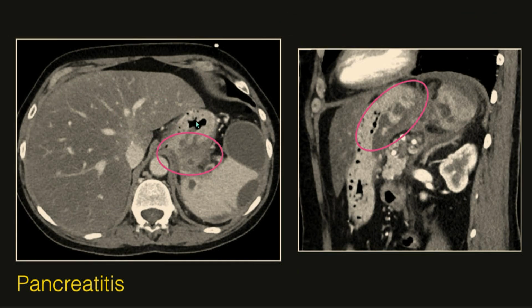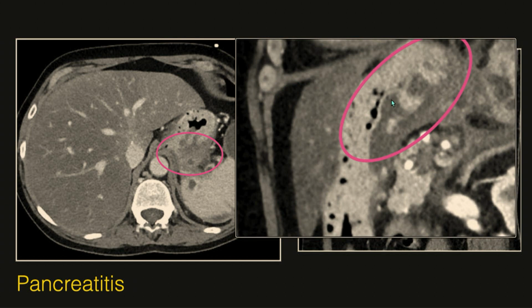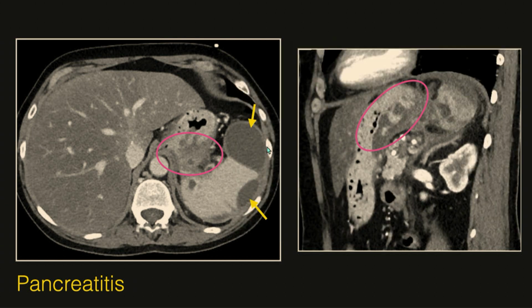And also another variation in pancreatitis that you'll encounter will be these dissecting pseudocysts. So pseudocysts are looking for some place to go. These pancreatic secretions are going to burrow their way into the gastric wall and form these lobulations. And then here we also have them around the spleen, subcapsular, indenting the parenchyma.